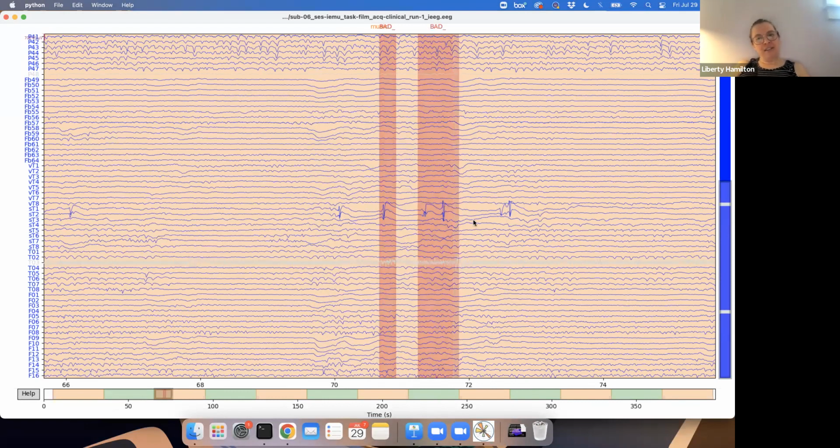For a lot of these, I like to try and encompass the whole time period. So if there are two that happened one after the other, you are going to want to mark all the way through it, because there's honestly not much point in looking at the tiny in-between data. For me, we actually remove these time points entirely. I know that in EEG, there are ways to remove, for example, blinks and other artifacts through ICA. I'm not sure I feel great about that, because if there are instances of seizure activity, they could be affecting your network in other ways. So I would probably err on the side of dropping those time points.